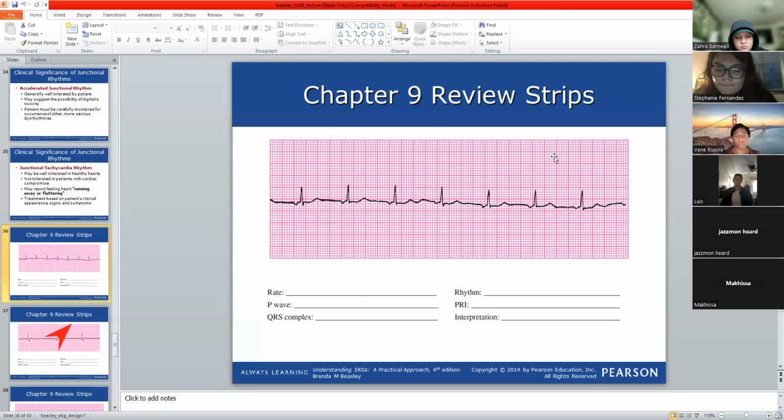You are not going to jump between this and that. And you mentioned for the rhythm that it is narrow; I heard some incorrect descriptions, and this is not accepted after all of this repetition and long time. This means you are not paying attention or you are not studying your chapter. Like we have here in chapter 9 review, I go with everyone.